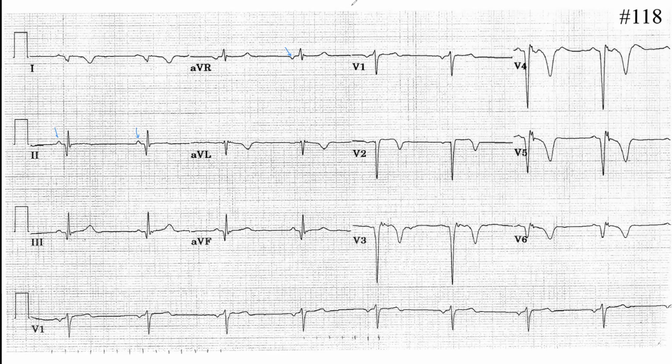Okay, all right. Now, next one, the morphology of the P, but that's a nice round, and it fits into the 1/4 of the big square, so it's okay. Yes. 0.1 second and 2.5 maximum, that's okay. PR interval, that's starting from the beginning of the P till the beginning of the QRS complex, is okay, normal, so there's no AV conduction abnormality.